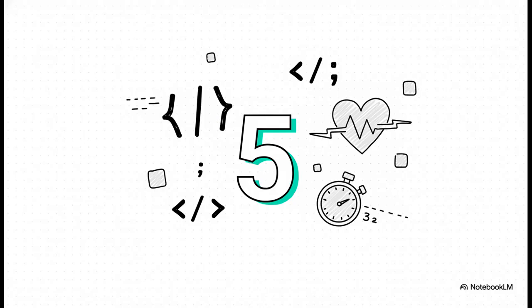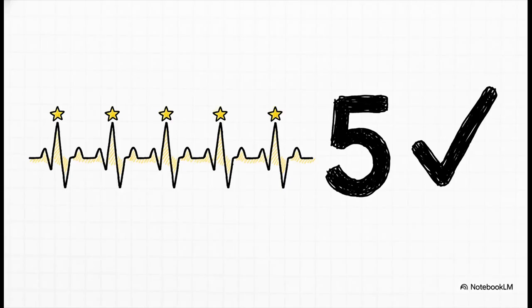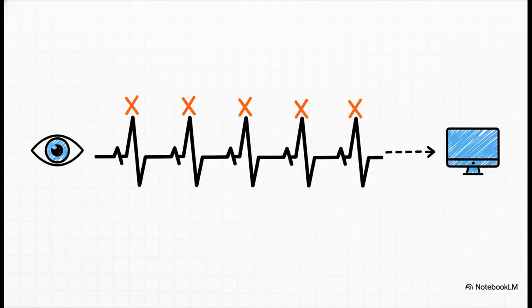So, we run our code on that 3-second sample using just that one simple rule. And the number it gives us back is 5. Remember that 3-second plot we were looking at? We counted 5 heartbeats, and the code found every single one of them. It correctly identified the location of each R wave peak. It actually worked.